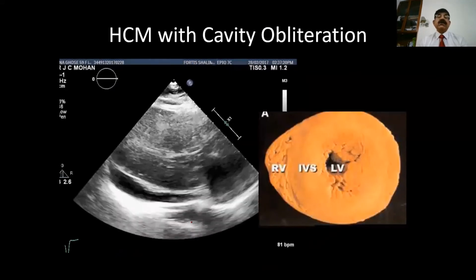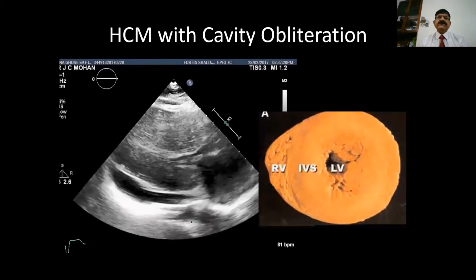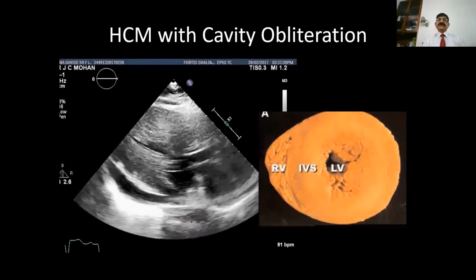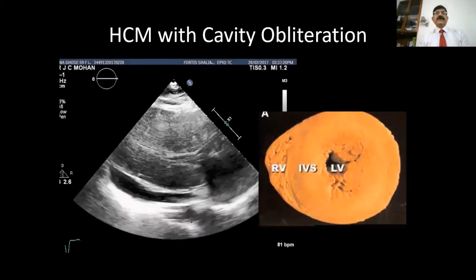She is about 55 years, and you note gross thickening of the walls and the left ventricle cavity is almost obliterated. In systole, definitely obliterated. In diastole, it is much less. This is Wigle's pattern 3, and this is associated usually with pericardial effusion.